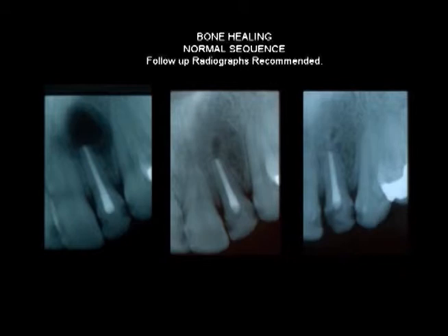There are cases where surgical procedures have been done, a so-called surgical scar has been left, and indeed the radiograph remains this way. Follow-up radiographs show no change. There are no clinical signs of infection, and this is normal healed bone.